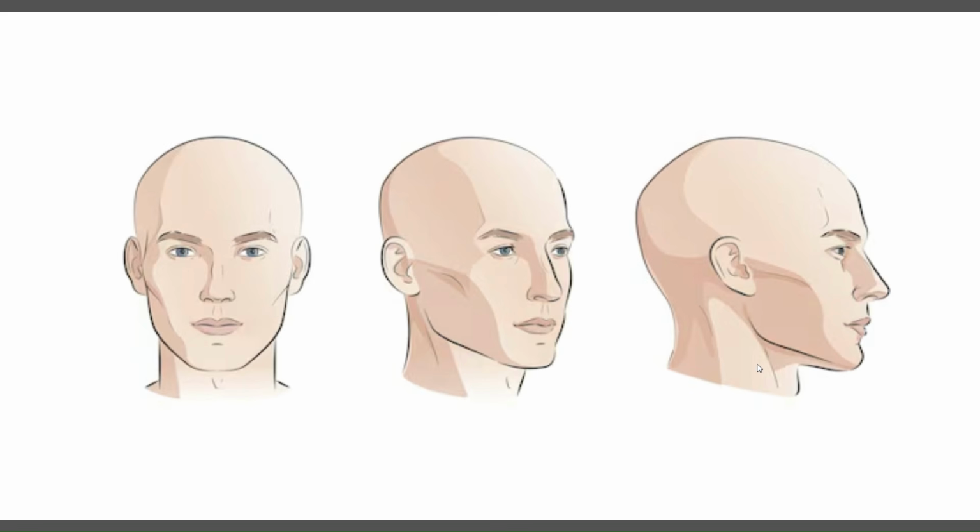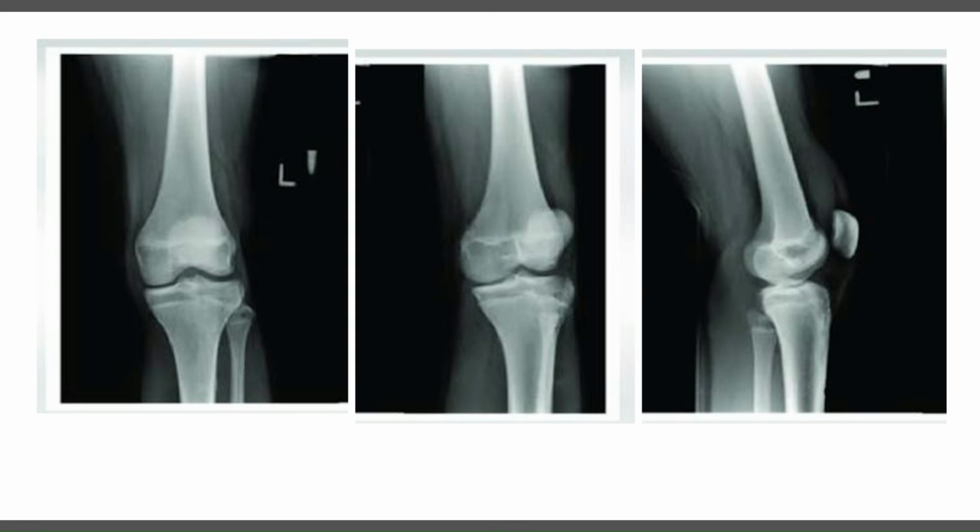All right, so the first thing out of your mouth is a description of the view that we're looking at. And AP, which stands for anterior posterior, just think about someone looking directly into the camera. A lateral would be someone in profile. The anatomic lateral view is someone in profile. And if it's somewhere in between, that is an oblique view.